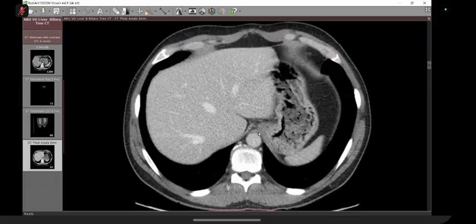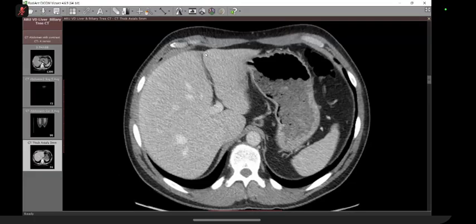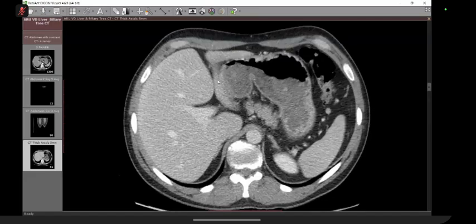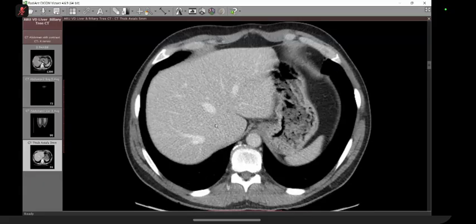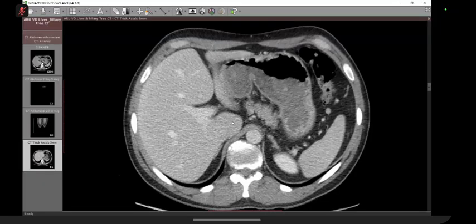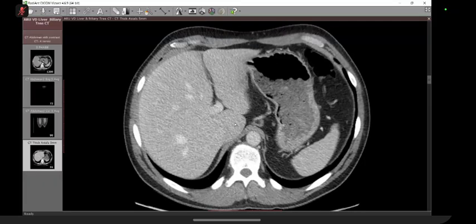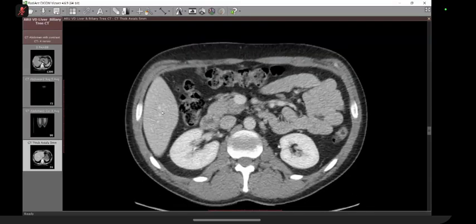Now, please remember that we use the vascular planes and some other planes to divide the liver. So leave it to one side. Now, with that, you have got this fissure, another fissure here. This one is another fissure. So this lobe, generally speaking, is the left lobe, and this one is the right lobe, and this is the caudate lobe. Caudate lobe enlarges in cirrhosis, right? So this is the caudate lobe, and it is also known as segment 1. So this is liver. As we go down here, the liver finishes.